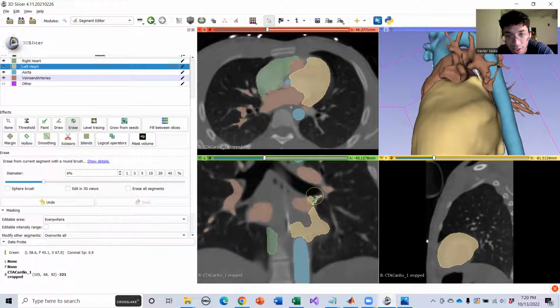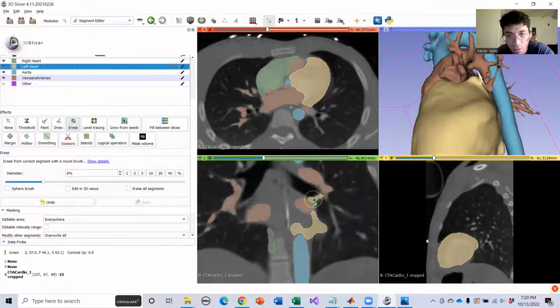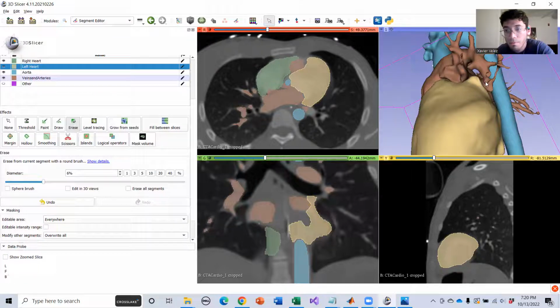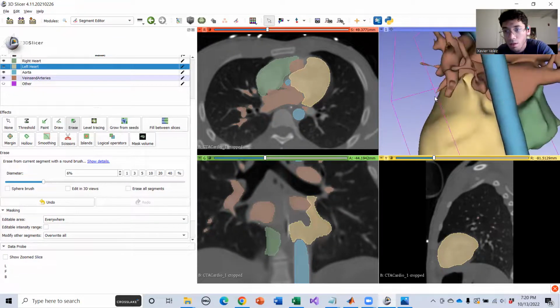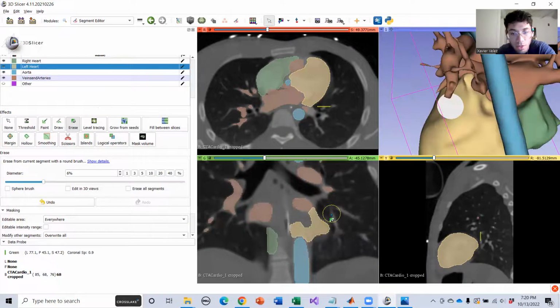I don't think this is part of it though. So we are going to delete that. And we're just going to keep going through and deleting everything that just doesn't quite fit, right? Let's take a look up here. Now we're getting that. And you know what? I don't like you either. Yep, you're going. Okay.